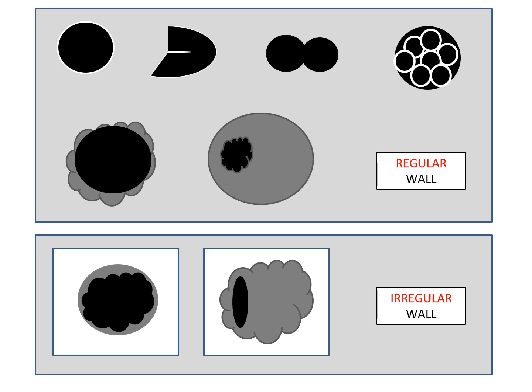So a solid tumor, or a tumor which is more than 80% solid, would be called an irregular tumor if its outer wall was irregular. Irregular walls are again different for cystic and solid tumors. For cystic tumors, it is said to be an irregular wall when the inner wall is irregular. For a solid tumor, it is the outer wall which matters.